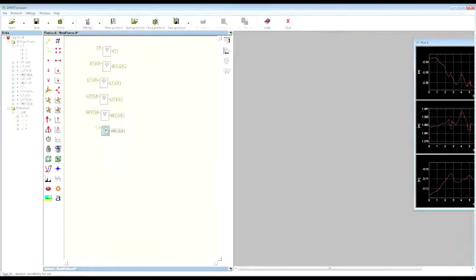I'm going to do the same also for the lateral wrist and for the medial. Okay, so for the first, the lateral wrist is the input, and for the last one, the medial wrist is the input.